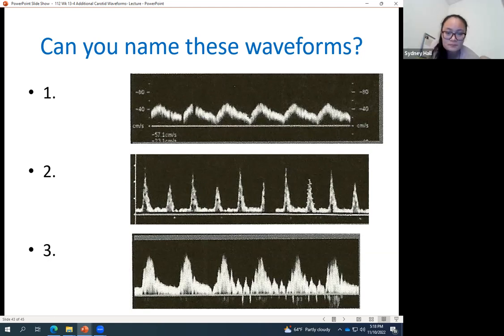Is it the arrhythmia? Yeah. Or is it more specific? So we're alternating high low. Is it the paradoxus one? Nope, it's pulsus alternans. Oh, pulsus, because it's alternating. Gotcha. Alternating high low, pulsus alternans.